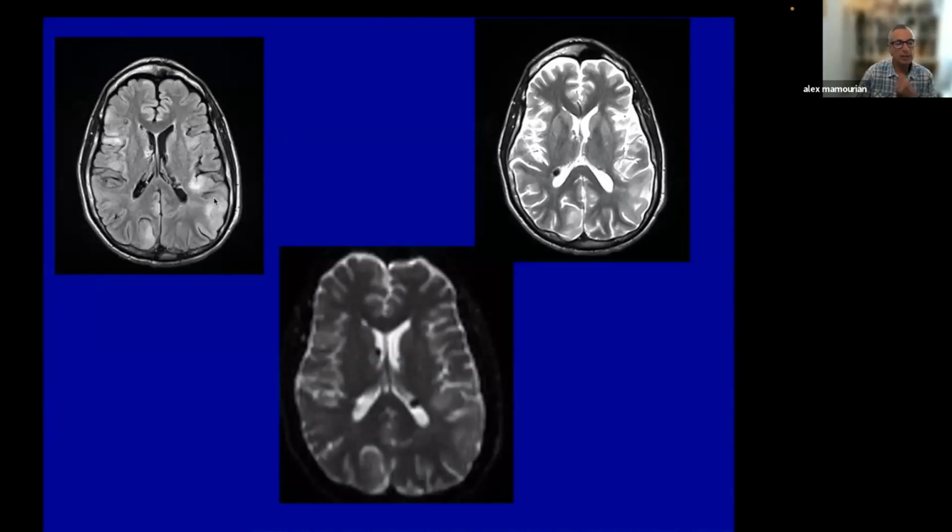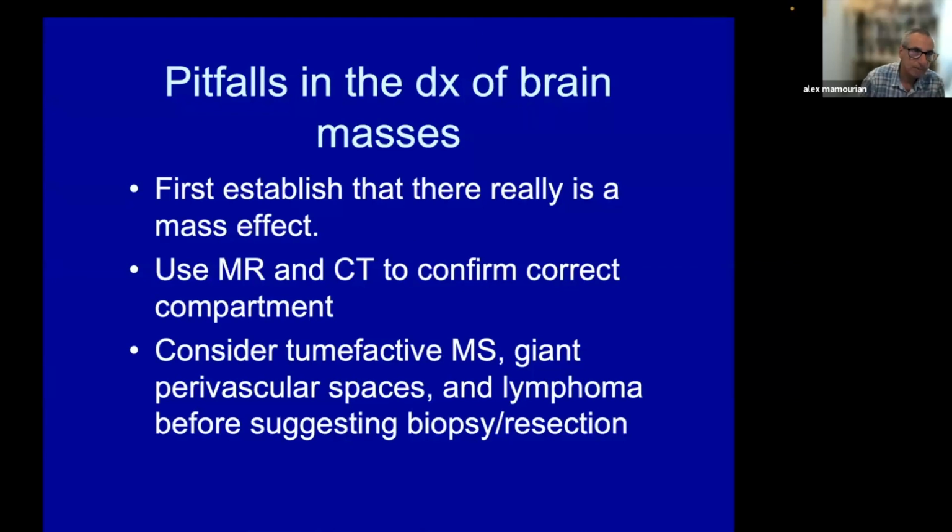This is another one that gives you multiple white matter lesions that, again, at first glance might be confused with multiple sclerosis. But if you look carefully, there are these areas of signal dropout in the ventricular margin. So this is the white matter change adjacent to these cortical tubers in tuberous sclerosis, and these would be the calcified subependymal nodules. So again, don't get tunnel vision about the white matter lesions. There are many other disorders that will give you scattered areas of white matter disease.